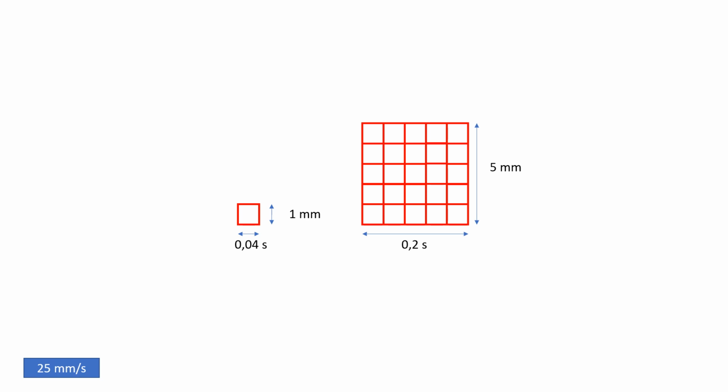At a really basic level, it seems illogical. And you will see, especially in the inferior leads, where usually there's low voltage as a default, that the ST elevation is below the STEMI criteria, even though it's obviously a STEMI by other measures. Okay.